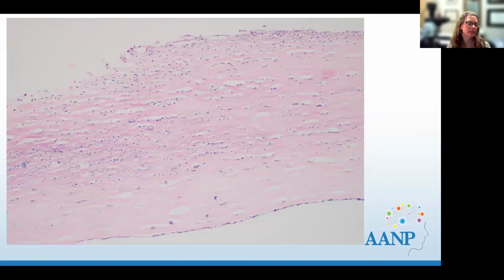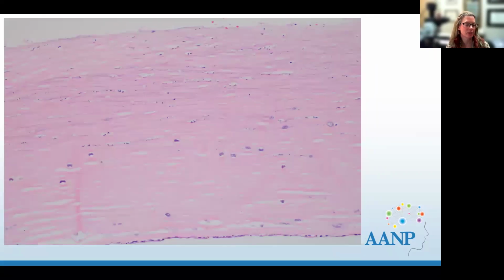And so here this is. You can see again that it's an ulcerated cornea and that there are a number of cells within the stroma, so way too cellular. And then if you start looking closely, you can see that there are organisms within the stroma. So this has a classic clinical story. And what it is, is that people are washing their contacts in water. So don't do that. I've often heard this story traveling abroad.